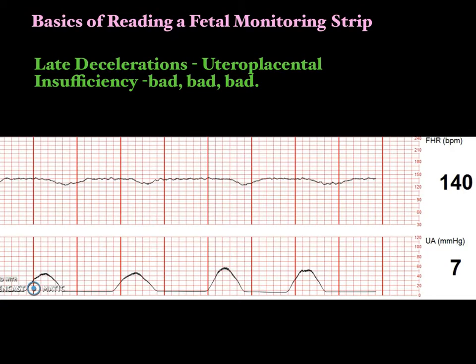Okay, so next we get to talk about late decelerations, and I hate lates. Most of the time you won't see them with moderate variability. They are a sign of uteroplacental insufficiency, and they are bad. They are all bad. Now, usually you can fix them, so you don't necessarily have to panic, but I want you to notice something. These are very, very subtle lates. Let me put a pointer on them. See, right there. That's a late deceleration.